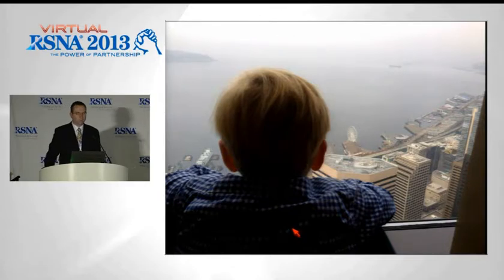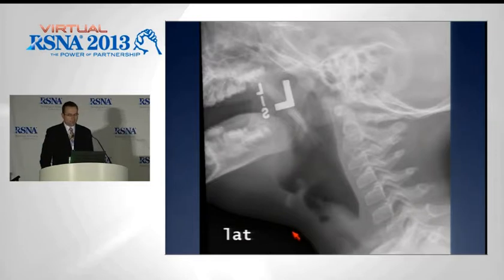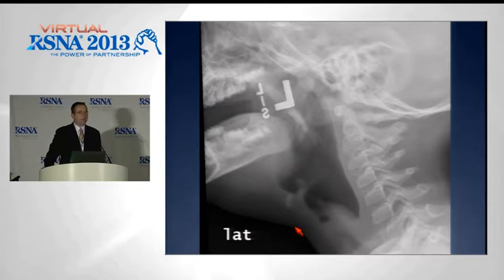Going back over what we have looked at today. Starting again with that lateral view that we saw earlier, that air hunger, that radiographic demand that we make a quick and accurate diagnosis. The distension of the hypopharynx here, focusing only on the lateral view, but clearly if you follow the upper airway, we lose definition of that upper airway. This is subglottic edema, and with stridor 9 times out of 10, it's going to be secondary to croup. But we're better than knowing 9 times out of 10. We'd like to know what that 1 in 10 could be, so when it crosses our reading space, we're ready for it.